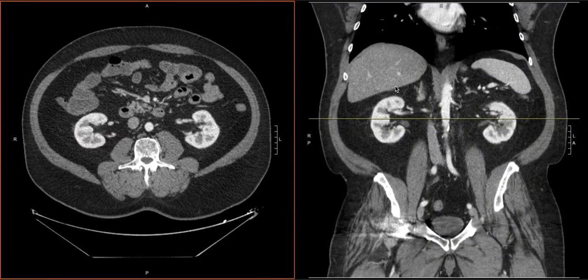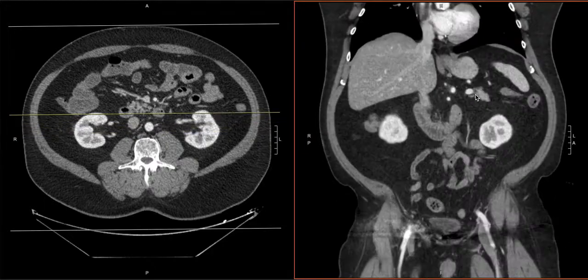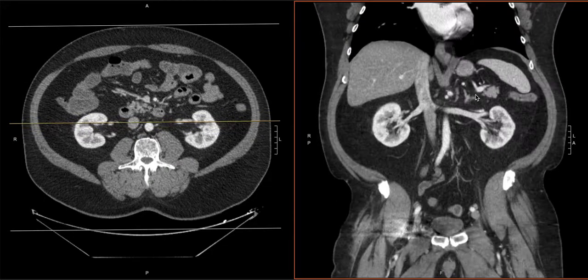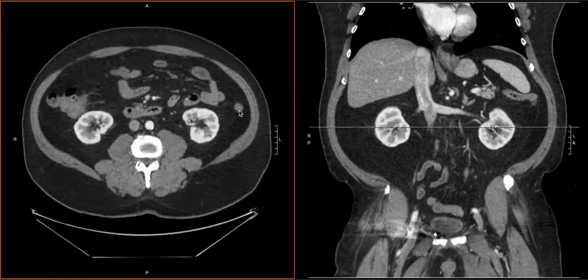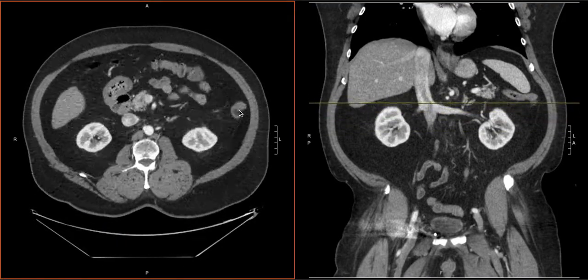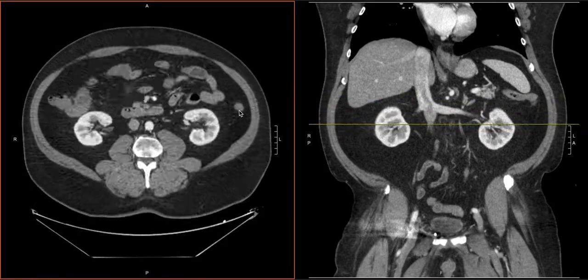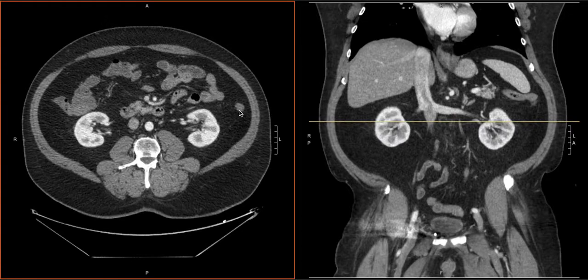When we're looking here, we see something. This might be an adrenal nodule, it might be a lymph node, but it's something we're catching here that we can investigate a little bit later. In terms of our search pattern, we're able to appreciate unique pathology based on using our coronal images. Now, these are pretty much all the major organs that sit in the superior aspect of the abdomen. What I like to do is find the ureter.